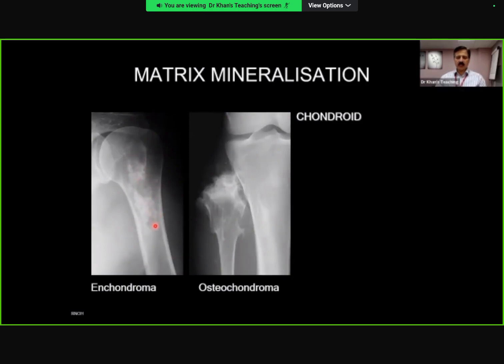And this calcification, remember, I taught you in the second chapter, three words: rings and arcs and nodules. So ring and arc type of calcification is quite pathognomonic for cartilaginous tumor because the differential diagnosis is bone infarcts, where it is geographical serpentinous calcification. So this is chondroid matrix.